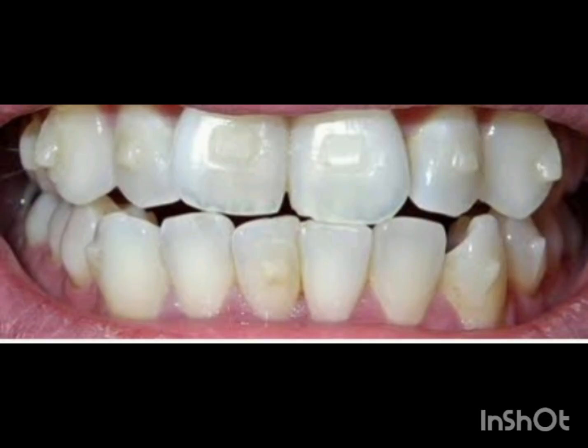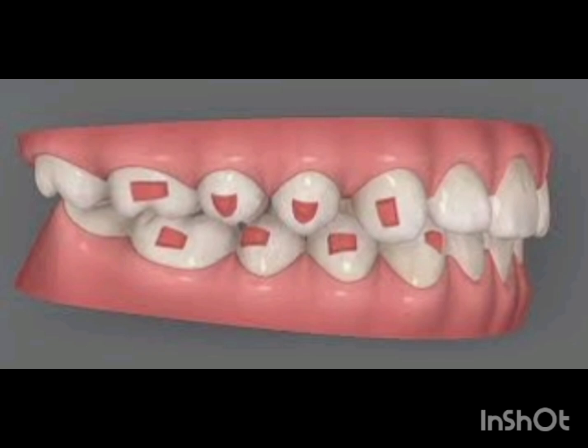And there are certain tips that can be kept in mind while doing a digital approval. Before approving the treatment plan, ask yourself: Is the diagnosis correct? Are the tooth movements realistic? Are the attachments appropriate? Is the IPR necessary? Is the final occlusion stable?